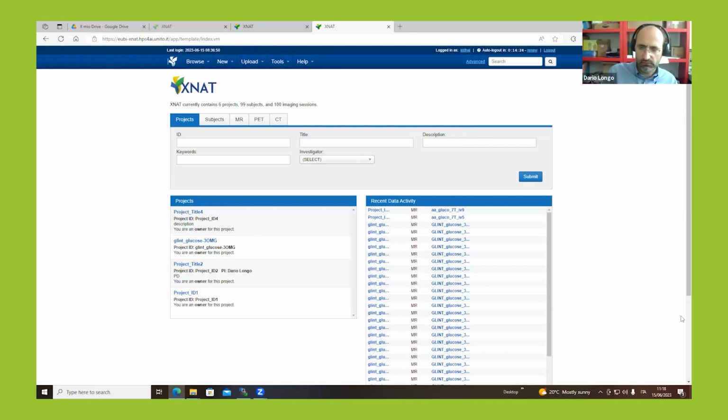Okay, thanks, Kranthi. There is also one more question I can briefly reply to regarding multimodal imaging: whether one can also save a transformation matrix, like from FSL, SPM, or PMOD, to overlay two types of data. Essentially, XNAT stores DICOM data, which is then usable to view in the OHIF viewer or to process. You can also store additional files.